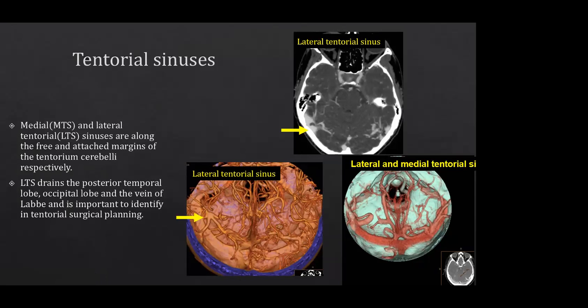Some sinuses which we don't usually talk about but are important to understand the presence of, because the implications are essential when we are contemplating any treatment. So these are the tentorial sinuses.